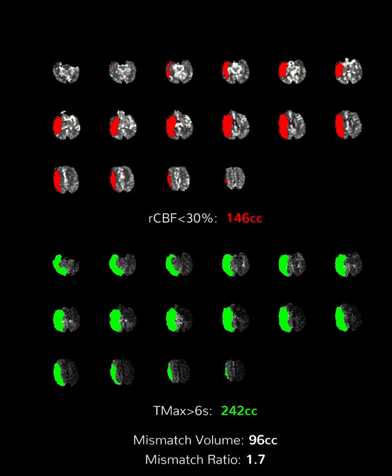So that decision comes from neurosurgery or interventional neuroradiology, who decide to take this patient to the OR and do thrombectomy or not. But for us as radiologists, now I know there is something actionable going on here. This patient can benefit from thrombectomy. So now I need to know, after perfusion, what is going on in my vessels.